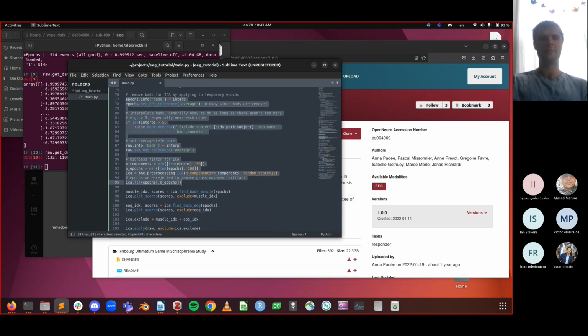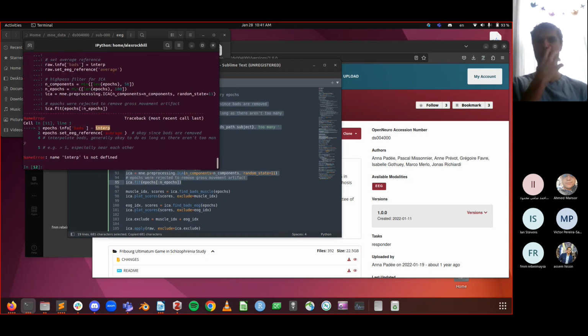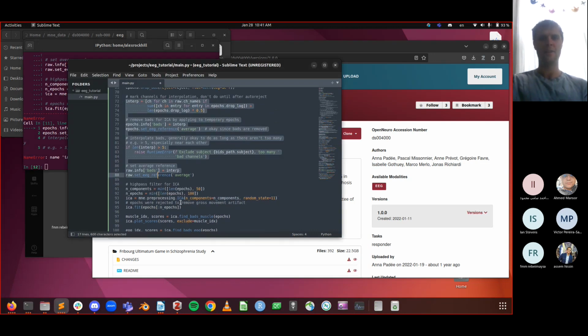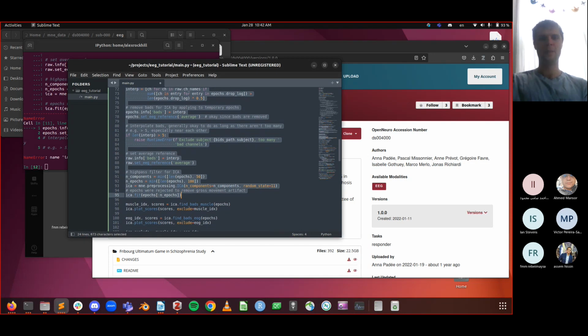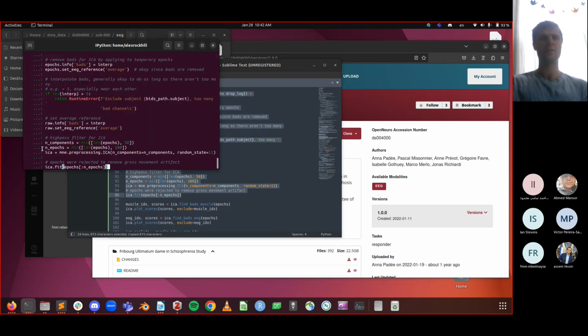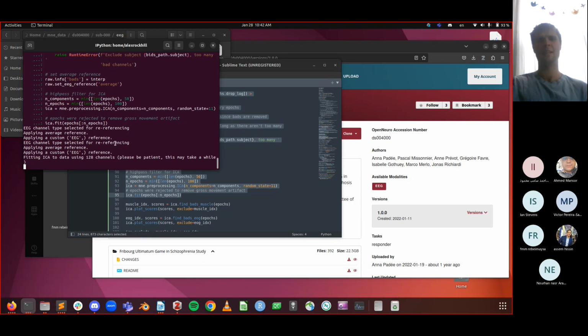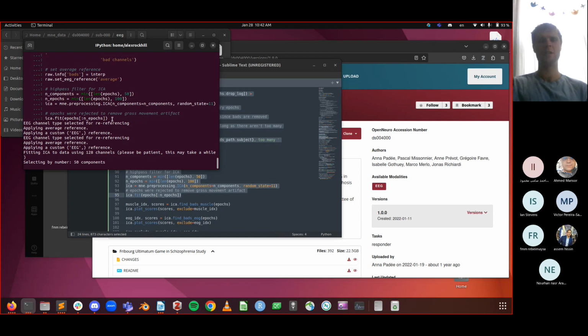This isn't maybe the best subject as an example because they don't have a ton of bad channels or blinks in there. They had a strangely small number of blinks in this case. So the ICA does take a couple of minutes to finish. Maybe I'll pause there while the ICA is going.